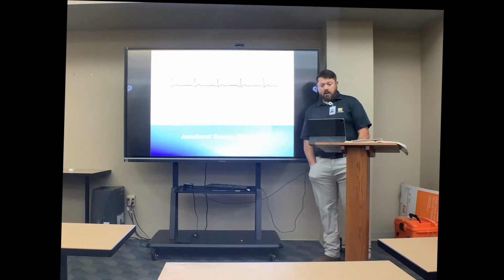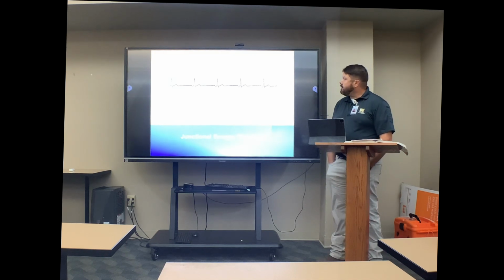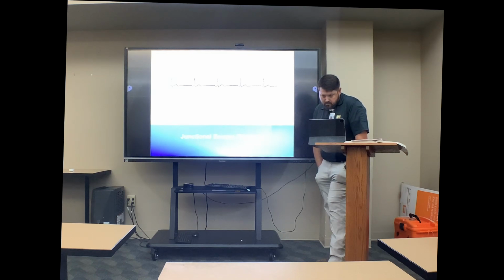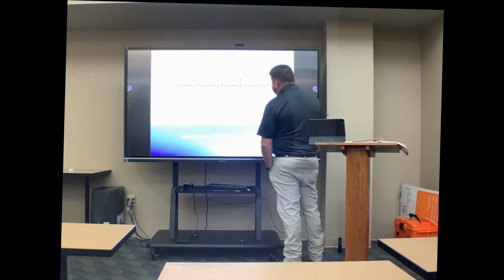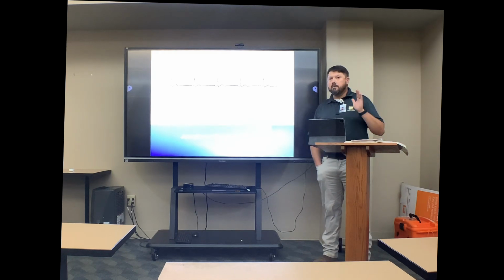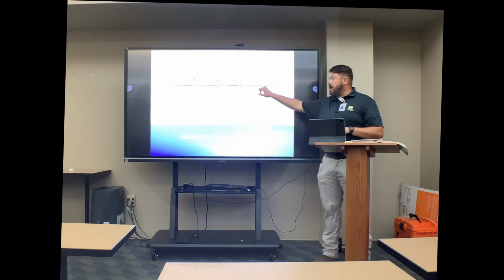All right. So, my heart rate. 1, 2, 3, 4, 50. Is it regular? It is regular. What about my P wave? Inverted. So, my PRI, let's say it's around 0.10. What's my normal PRI? 0.12 to 0.2, yes. But it makes sense why that would be shorter, right?